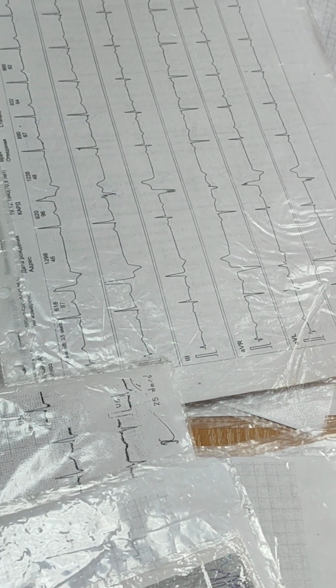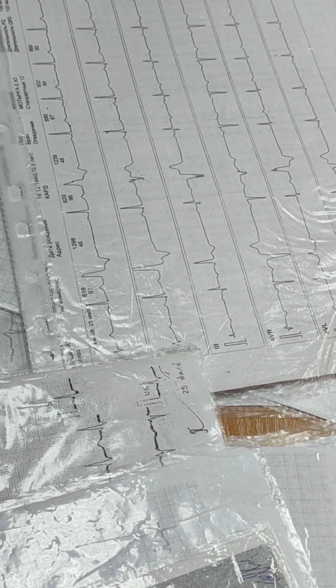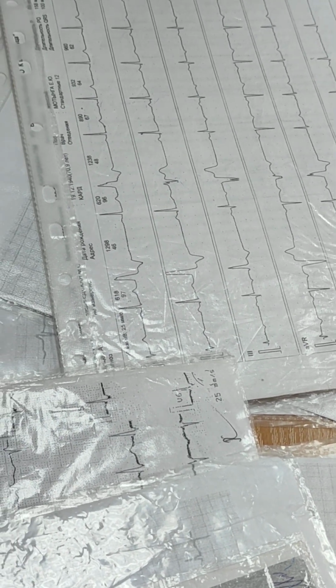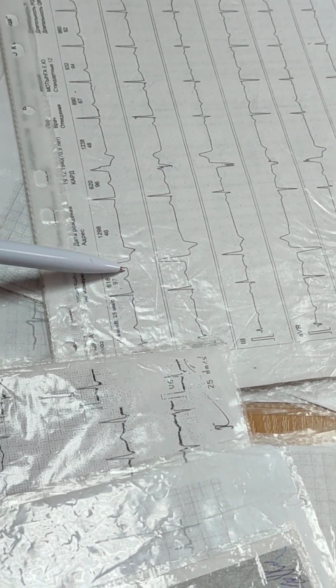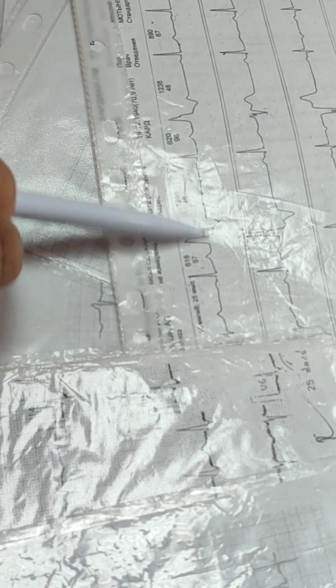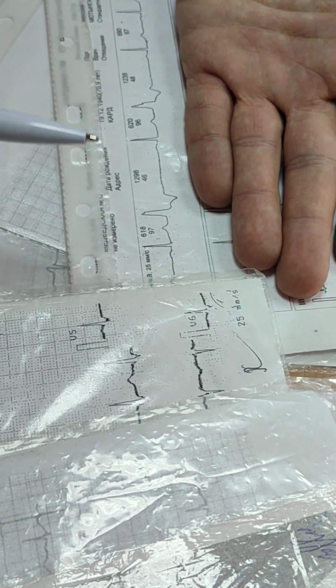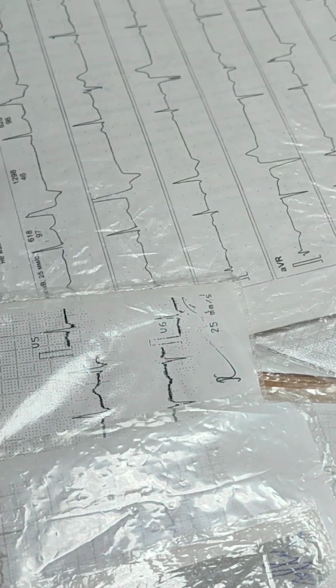What is it? Is rhythm regular? No. Is the P wave here? No. And this complex is deformed. After this complex there is pause. Extrasystole. Ventricular extrasystole. If you see one wrong place in lead, only 1-2 wrong places, it's extrasystole. If complex is deformed in one place.